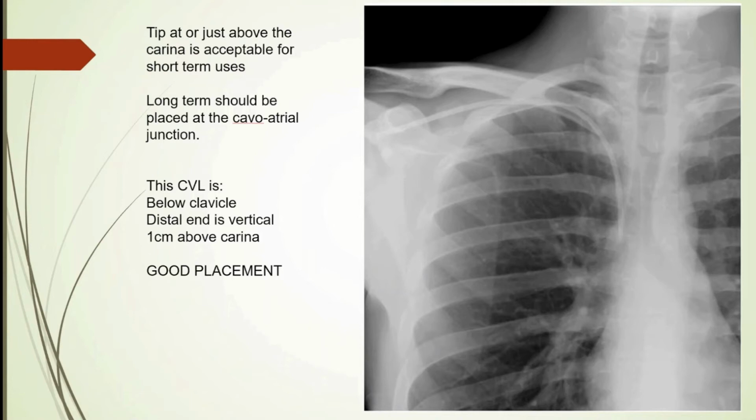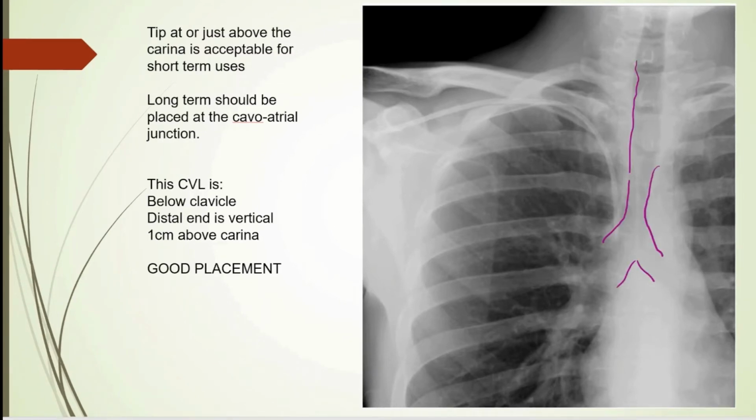And here we're just looking at the carina, and this looks like a line placement here at the bronchus. There's your carina. B for bones. I'm not going to mark it up because I want to be able to see that line clearly. Looks fine. Of course, we only see the right-hand side anyway, so we're going to have to skip a lot of this. C for cardiac silhouette.